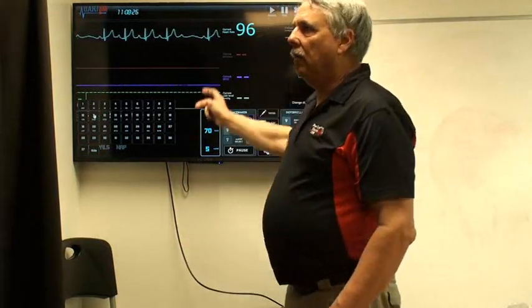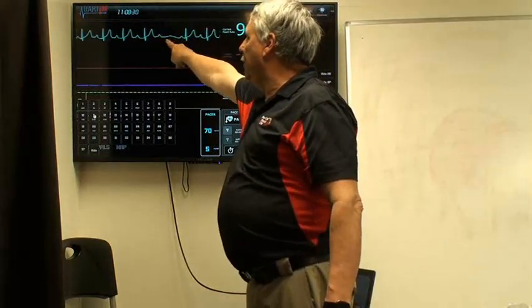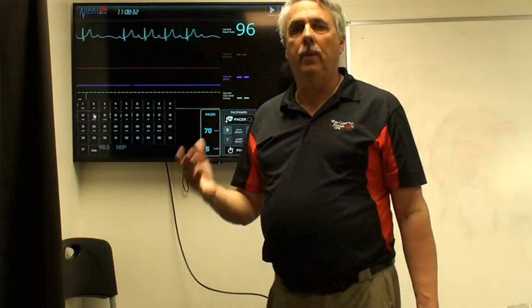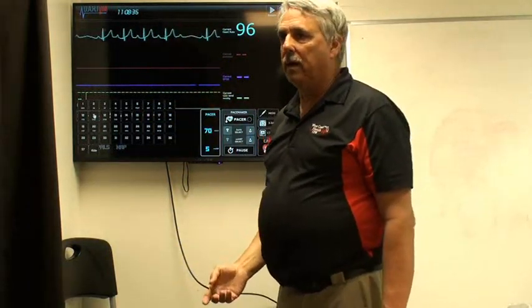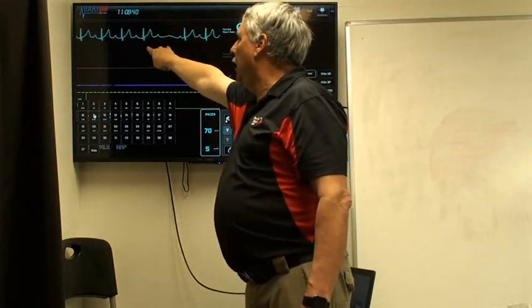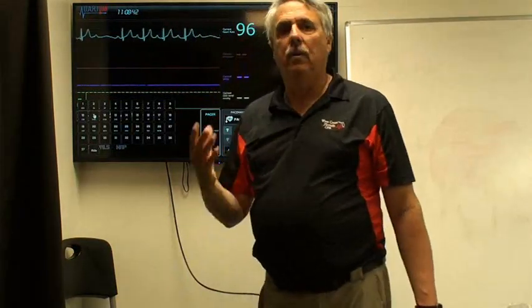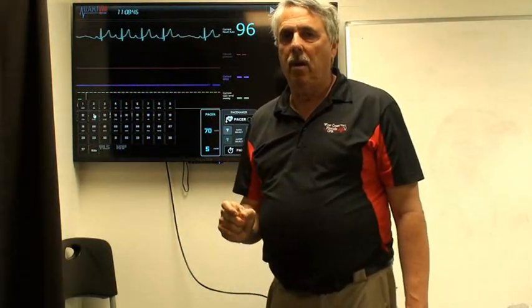Here we've got to see if it's a block first. We see a P without a QRS complex, so we know there's a block. So we want to rule out third degree heart block next. So we go R to R wave, and there's not one right there, so it cannot be a third degree heart block. So now we have to look at the PR interval.